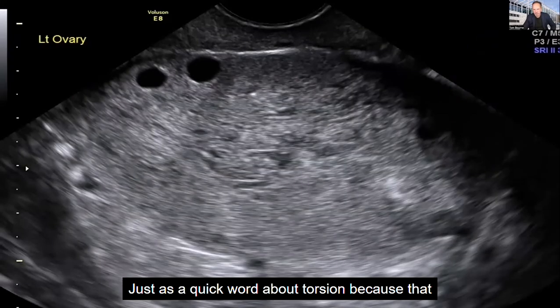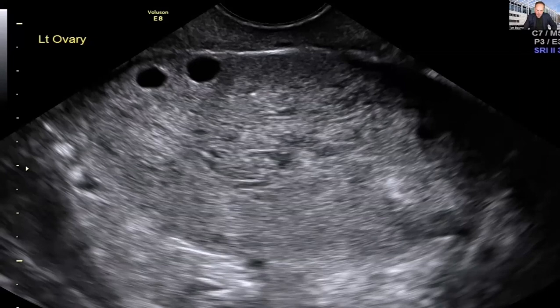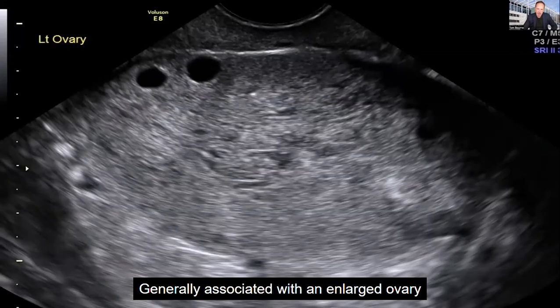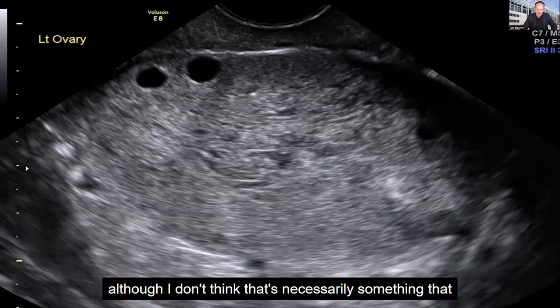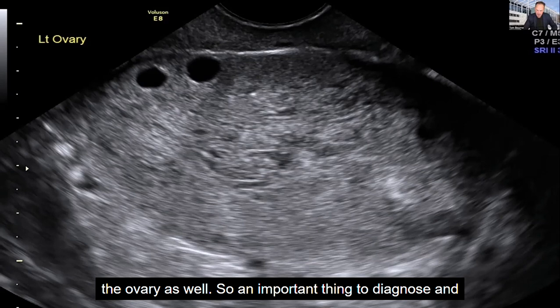Just to say a quick word about torsion, because we're not speaking about this, I think, elsewhere in the Ultrasound Essentials program. Torsion is generally associated with an enlarged ovary, often misplaced above the uterus, sometimes actually even easier to image using an abdominal scan. You get this lack of architecture and sort of edematous appearance, often with peripherally placed follicles, and a sort of blurring of the internal architecture and the presence of the so-called whirlpool sign, although I don't think that's necessarily something that you need to be looking at too hard, and you often get some free fluid around the ovary as well. So an important thing to diagnose.